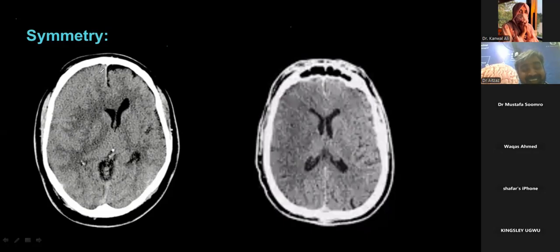Where is it? I cannot see. Right frontal. This one? Yes. If it is only the right frontal one?